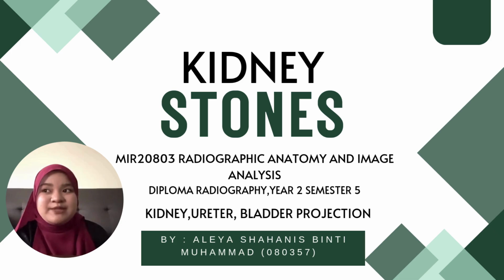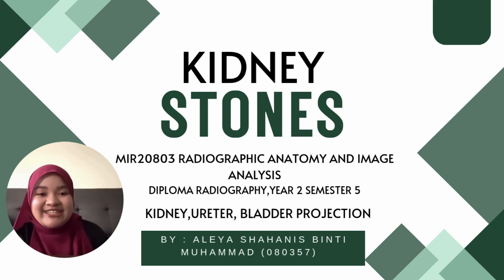So, today I will present the radiographic image analysis of a kidney stone, which is demonstrated in the KUB view, which is the kidney ureter bladder view of X-ray.